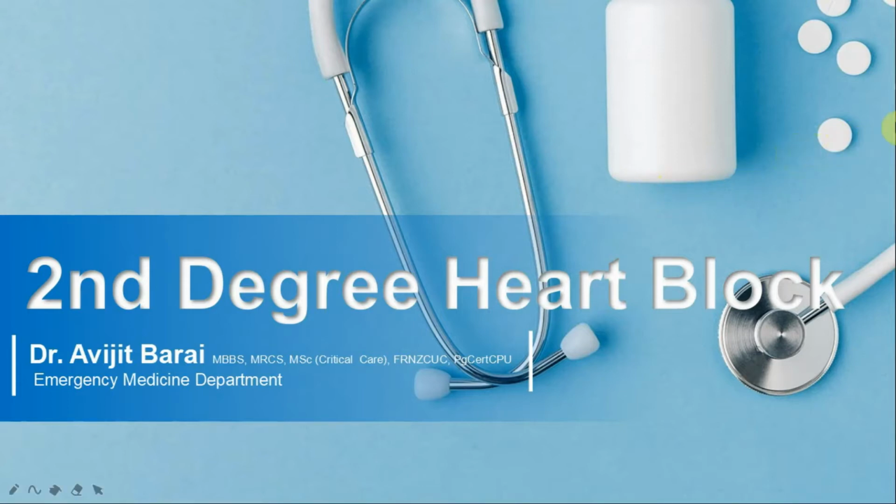Now in this video I've got Becky with me, who is going to interpret the ECG in a very systematic way so that we don't miss the important parts. Welcome Becky, thank you for being with us.